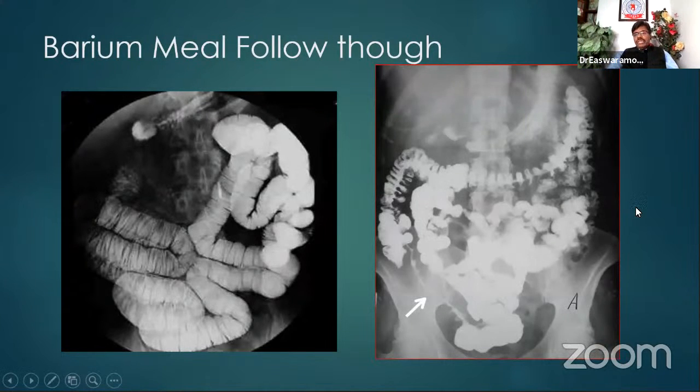And here if you see, there is an abnormality. These are all small bowel, this is the large bowel, and this is the stomach, all with the barium at various times. Don't worry about that. If you carefully see from the stomach, duodenum very seldom seen, jejunum, here jejunum, ileum and ileocecal junction, ascending colon. I showed everything. Now Bharat, back to you.